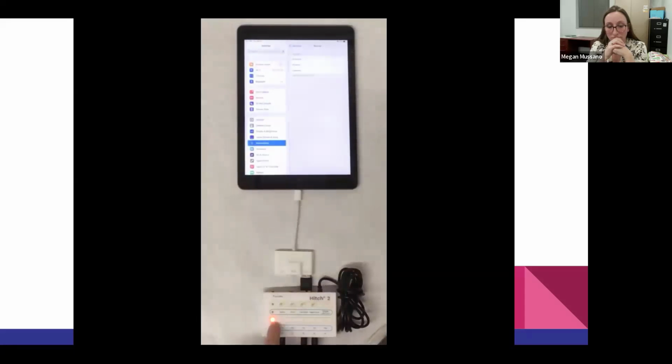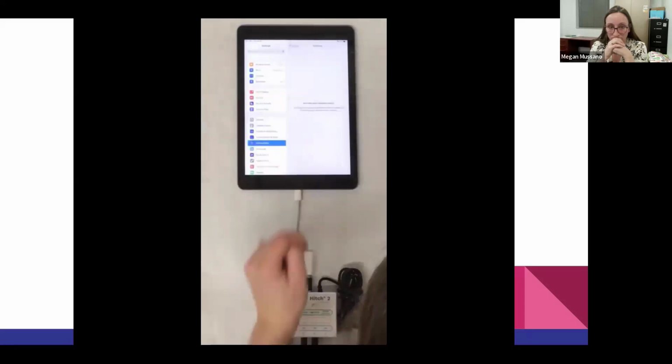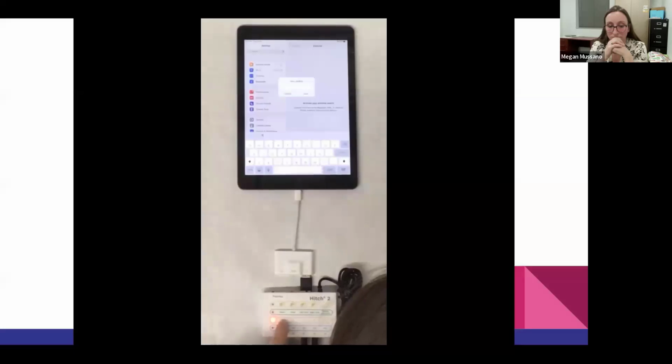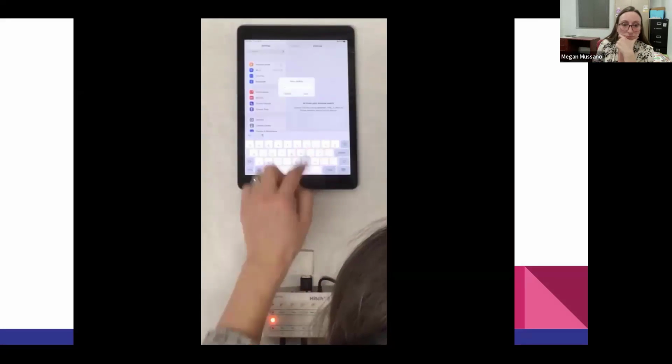I'm currently using the Hitch 2 in the orange row, which will be the up arrow, the left arrow, and the right arrow. This will make more sense later based upon what we are programming. To add the switches, you hit external and you activate your external switch. First, I'm going to do orange up arrow. Go ahead and label it based upon the switch interface. So I'm going to name it orange up.